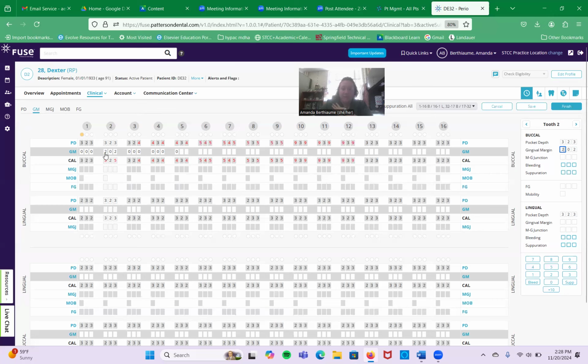But for the most part, teeth don't appear to have recession on the interproximal, so we will just be putting the recession number that they give you, and they give you the highest recession number right in the center bubble. So if there's 4 millimeters of recession, you would highlight the middle bubble, put in the number of recession that they are giving you, and then it's going to change that CAL, that clinical attachment level. You can see automatically it's telling them what that clinical attachment level is.